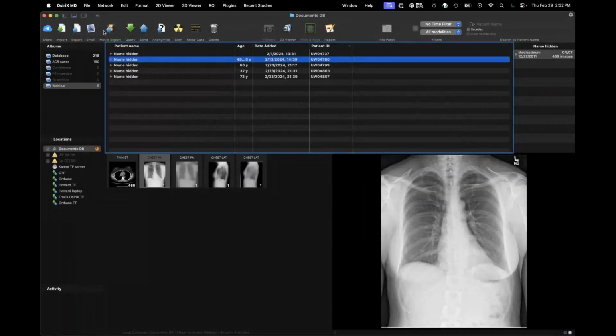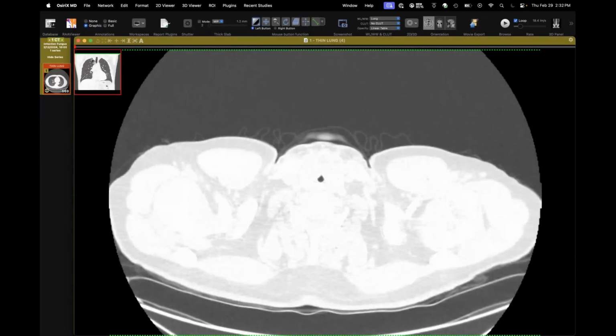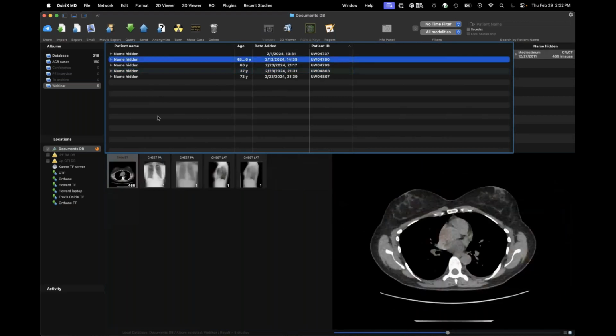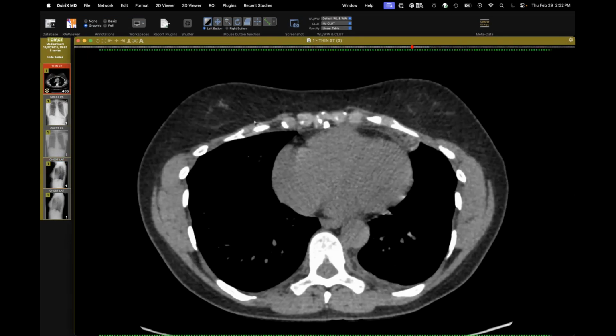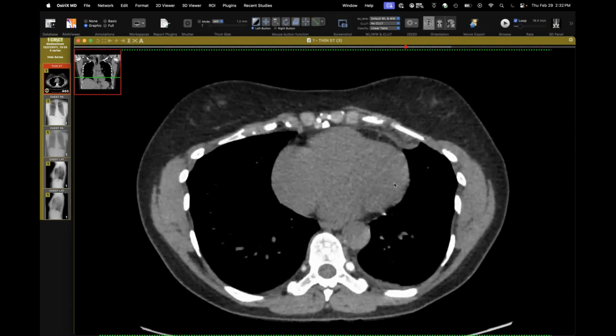All righty. There was a left pleural effusion along with that too. Yes. Sorry, I should go back and show that. Where did I have that? Yeah, right there, a little blunting of angle there. Yes, and that's another finding that can be helpful because it does irritate the pleura, and that's why they get the pleuritic chest pain.